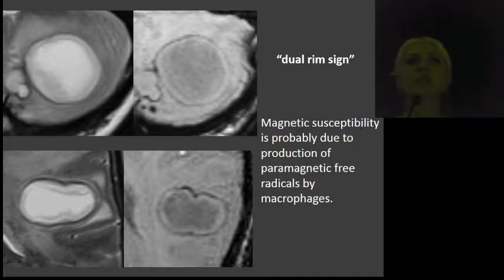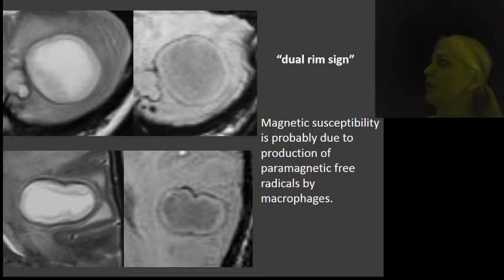When I first read about that, I thought, but why would that be so? Why don't we see this in other imaging? As Paul said, what are we actually seeing on this SWI? Well, if you would do a very nice, high quality T2 weighted image, you would also see that the capsule has several layers. So these are patients where I saw the dual rim sign, and I put a T2 on the left side to see the capsule and these several layers.